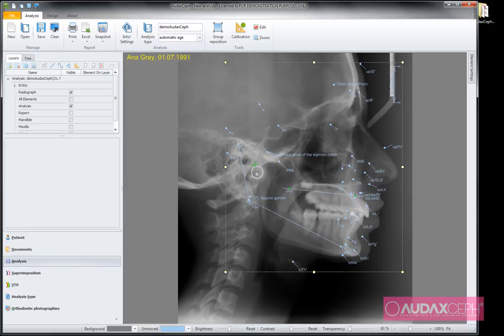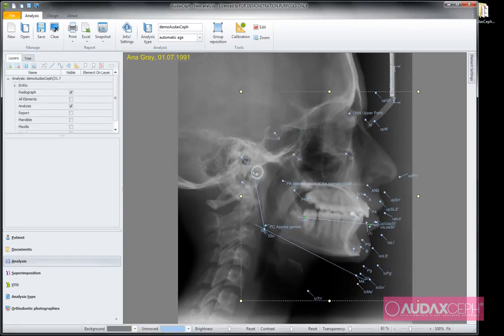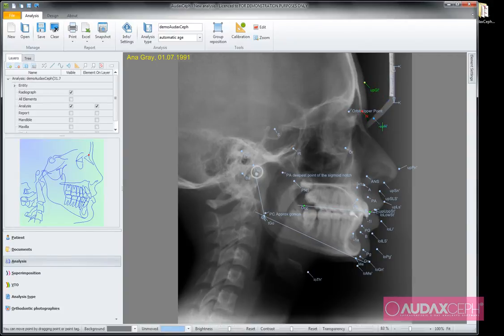Now you can notice that all the geometry is bound to a mannequin, and now I'm going to move that mannequin and place those points very close to the location where they should be. All the geometry is in one color, it's gray. When I move the point, it becomes another color.